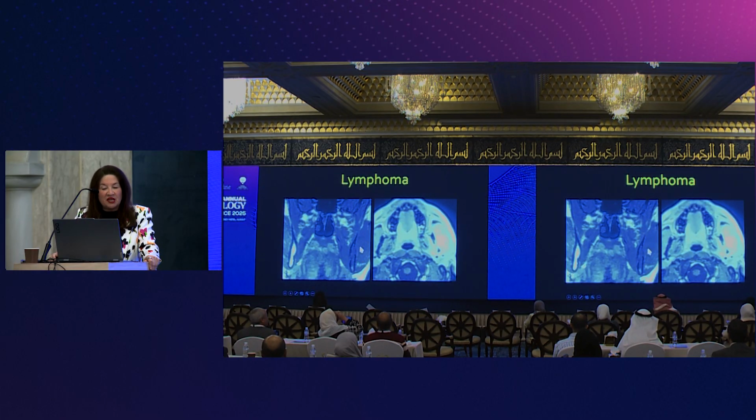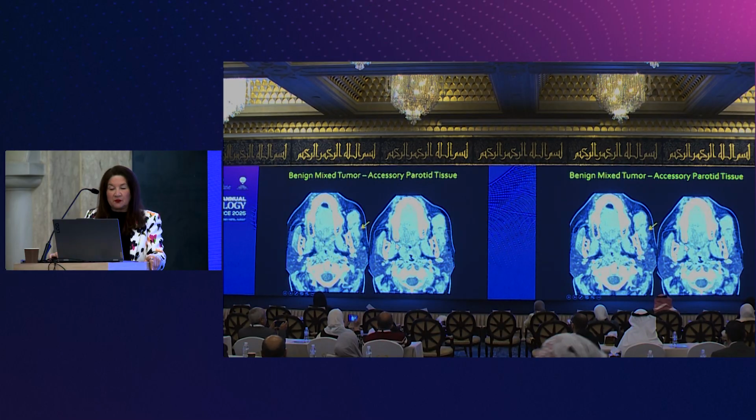This is a patient, and you'll see a mass arising from the bone and the marrow. Here's the normal marrow on the other side. You'll see areas of cortical destruction, and you'll see an enhancing mass in the masticator space on both sides of the bone. This is almost always either metastasis or lymphoma. In this case, it happens to be lymphoma.